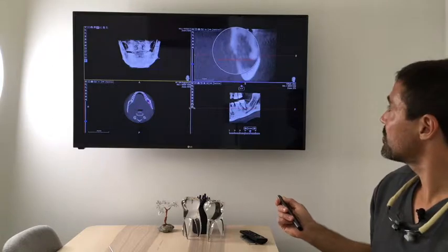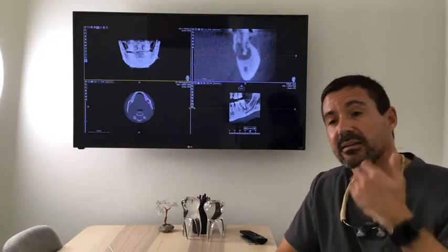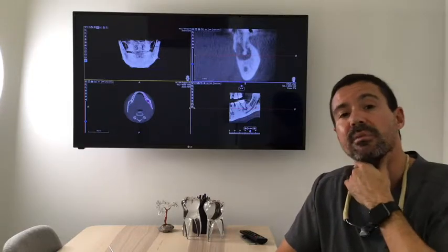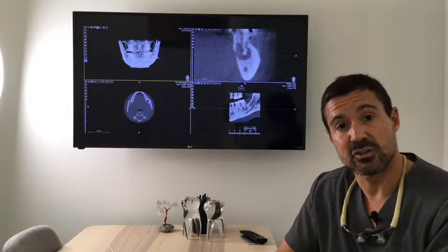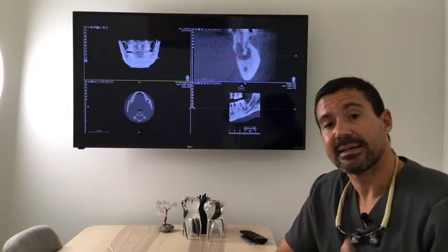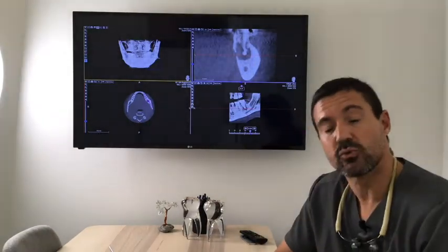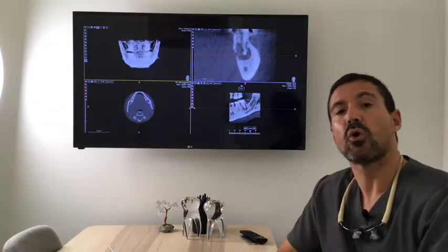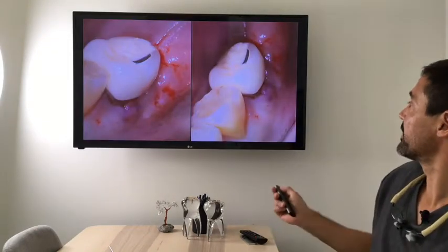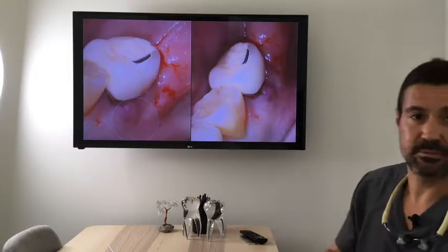Well, if this cyst is really, really deep down, probably the patient might experience drainage of that cyst at the bottom of the mouth, and that might be very dangerous. In this case, we had luck because it wasn't that deep inside in such a lower situation. It was a little bit high, so the patient at the clinical pictures was already developing a little bit of redness and also some fistula on the lingual aspect.